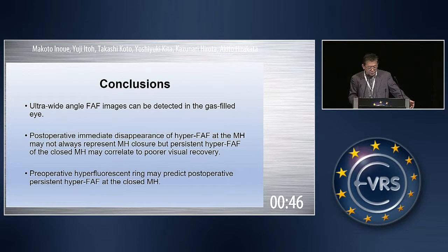So, conclusion: ultra-wide-angle FAF images can be obtained in gas-filled eyes. Immediate disappearance of hyper FAF at the macular hole may not always represent macular hole closure, but persistent hyper FAF at the closed macular hole may correlate with poor visual outcomes. Preoperative hyperfluorescent ring may predict persistent hyper FAF at the closed macular hole. Thank you for your attention.